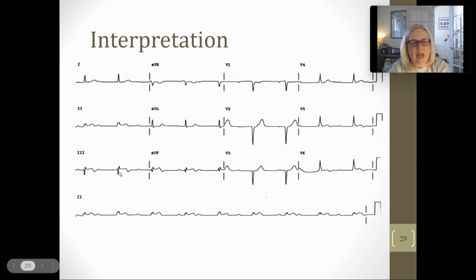So we've got ST elevation with T wave inversion, which is the end game of the MI. So this is a STEMI towards the end. Okay, so it's safe to say to the doctor or surgeon that they're having an infarct in the inferior region of the heart. And why is it inferior? Because it's in 2, 3, and AVF. That's the inferior region of the heart.